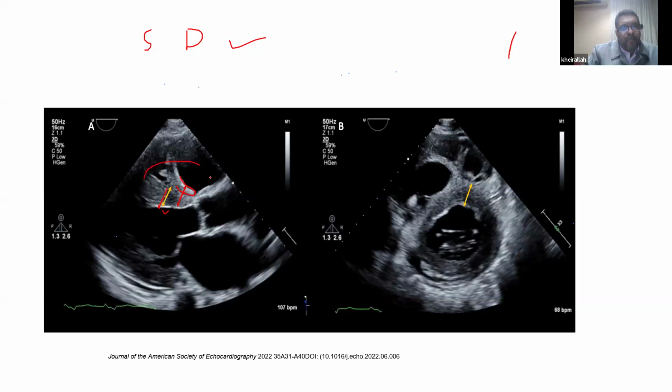So if you have a problem in here, you can use the short axis, because the short axis can eliminate the trabeculation coming from the RV. So the LV thickness isn't always easy, and you have to be mindful of this caveat in the measurement, okay? Including RV trabeculation or choosing the wrong point or being too oblique, all these things, okay?